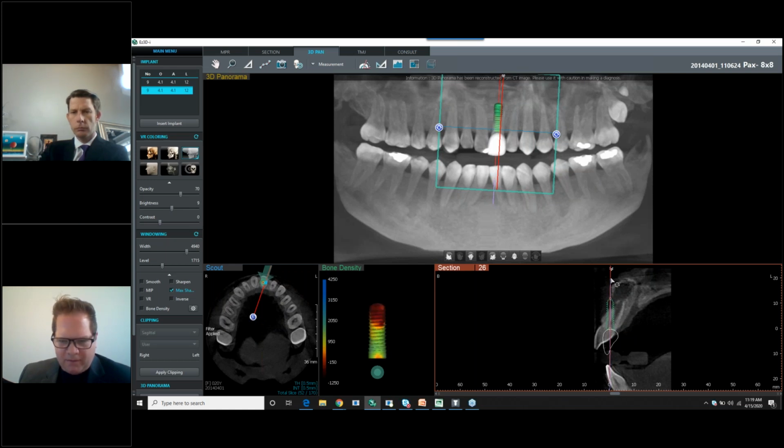And we can tilt it. So we can tilt it near the apex or the occlusal area, but it has that axis tilt line on each side, so we can direct it that way. Great. Perfect. So a couple of right-click options here on the implant.